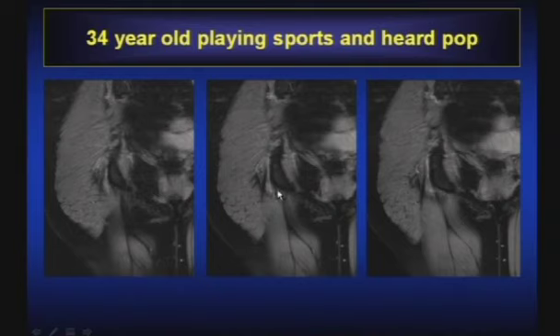Now, intimately associated to it, just adjacent and anterior, what do we see? So that's the adductor coming in. You can imagine that if you weren't really careful here, you might run all the way down this surface and think, oh, I've got an intact hamstring here. That conjoined tendon looks okay.